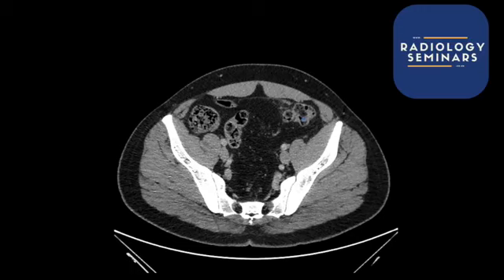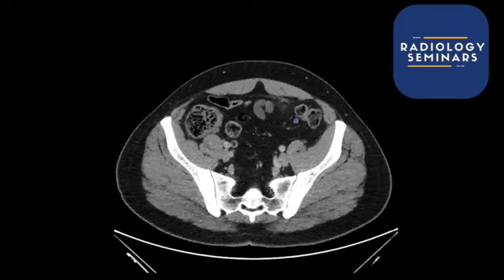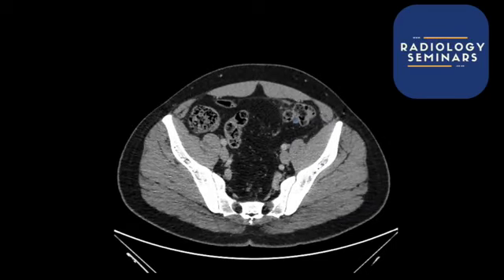inflammation of the appendage. So this is called epiploic appendagitis, not appendicitis, epiploic appendagitis. So you get these finger-like projections that help keep everything in place. And what can happen sometimes is that the appendage can actually infarct. You can have this, so this is the mesenteric side, this is the anti-mesenteric side on the other side of the mesentery, and you can get anti-mesenteric inflammation of an appendage. And that's essentially what this is.